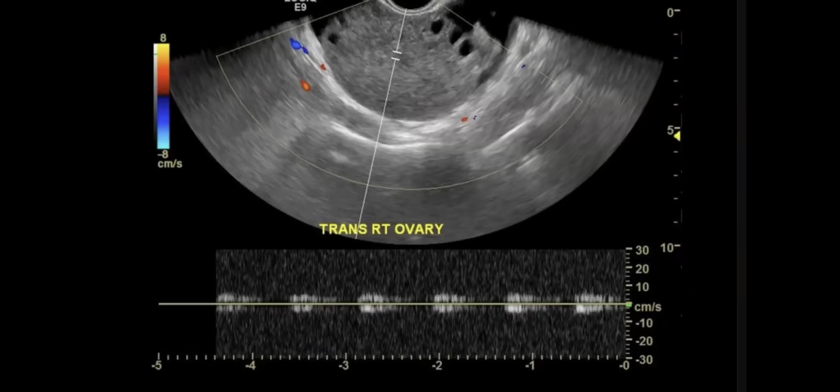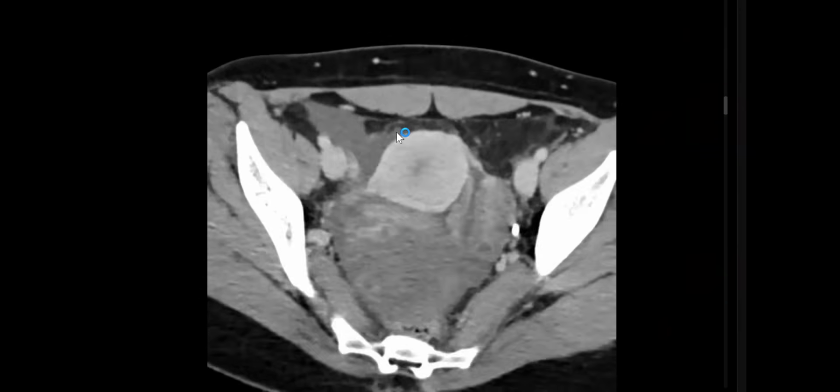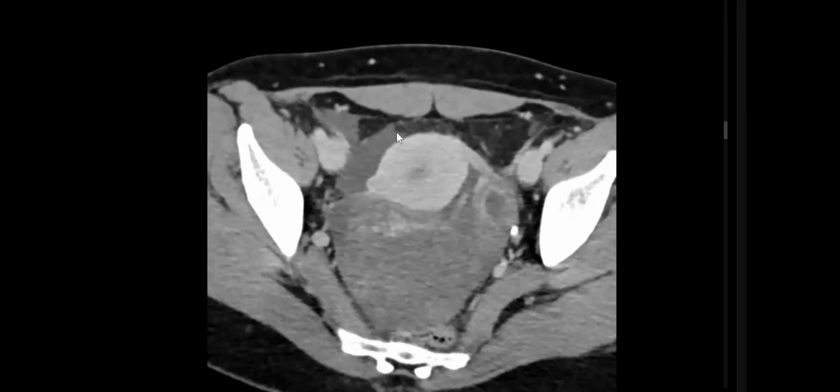Very good, very good. Let's revise one by one. Very good, Abbas. It's an important case for practice and also for exam. Acute severe pelvic pain or intermittent pelvic pain, on and off. It's a classic for ovarian torsion in middle-aged female.